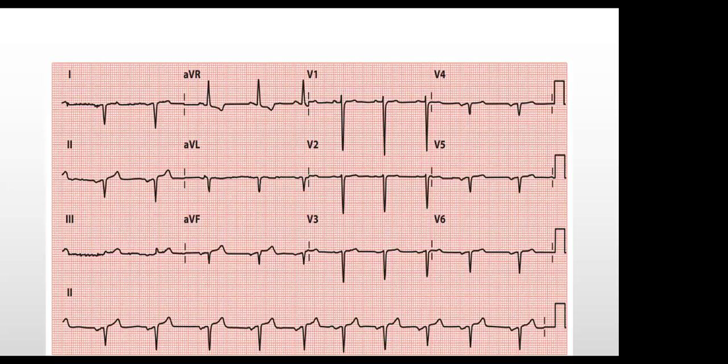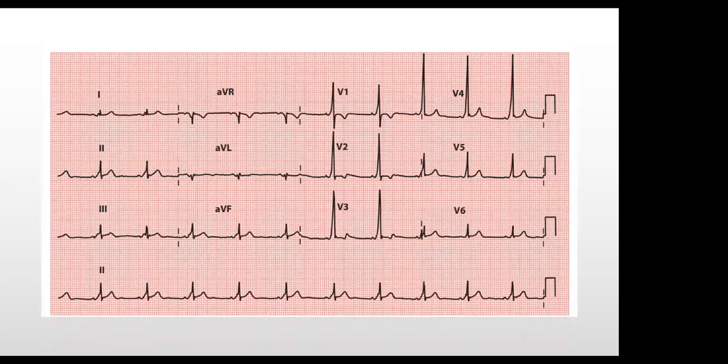All right. Okay, so just bear that in mind. Dextrocardia, this is it. I'm sure we can look at the differentials and discuss what follows. Okay, so quickly, flashing the ECG before us. What do you think this is? So who's going to help us? Anyone? Maybe I will try. Yeah, please.